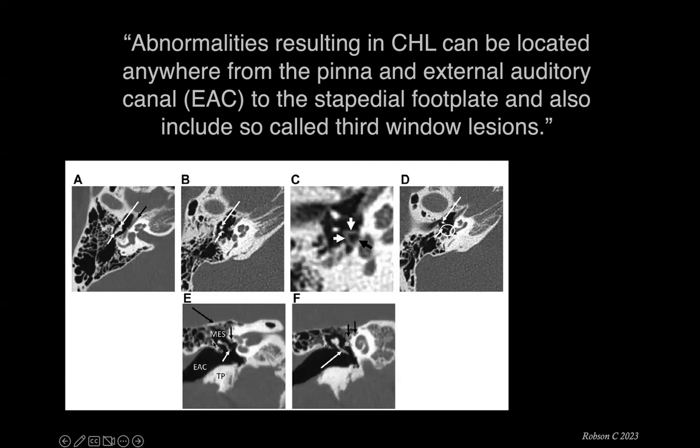And this is the appearance of the ossicular chain in coronal. This is not a lecture on the anatomy, but please remember, you need to know the anatomy very well if you want to pick up subtle pathology.